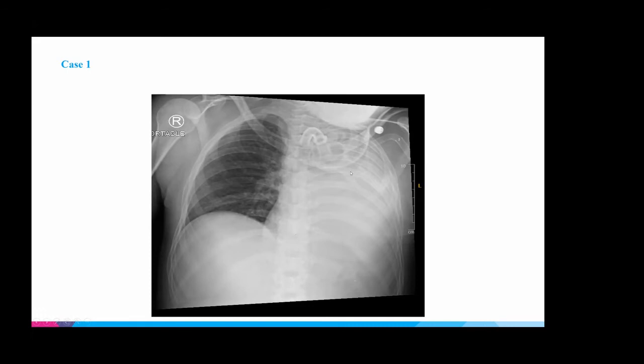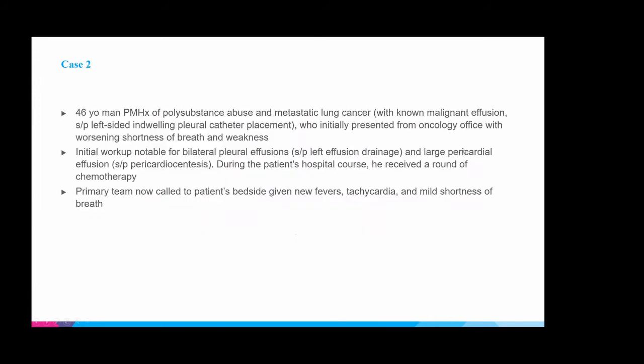So potentially this could be white out from atelectasis, where there's complete collapse of the lung. You can also maybe make out the right main airway here, and then potentially the left airway goes here, and there's a little bit of a cutoff here. So to me, this would suggest that there may be some mucus or something obstructing most of the left main airway, leading to atelectasis of the entire left hemithorax.